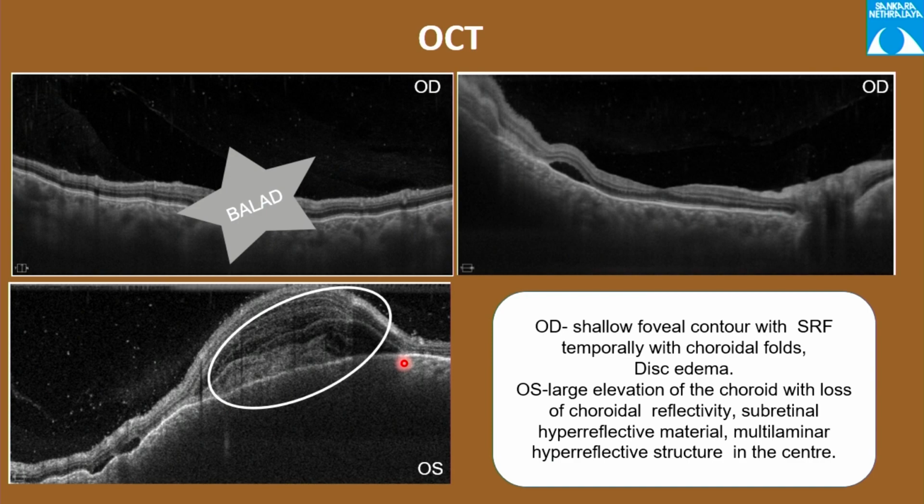Not your PVRL. PVRL will again have some of these features of sub-RPE infiltrations. But a straightforward uveal lymphoma, which can be a T-cell lymphoma also, can present like this. If you have these undulating choroidal lesions, with the choroid fully undulating like that, thickened uveal tissue, that can be one of your differentials.